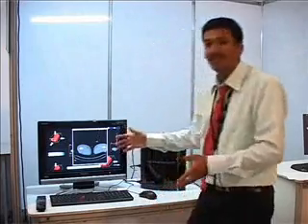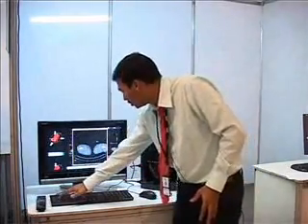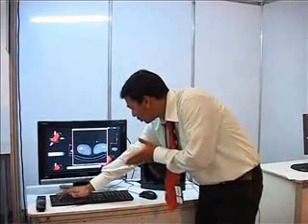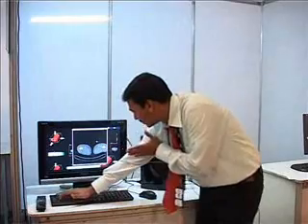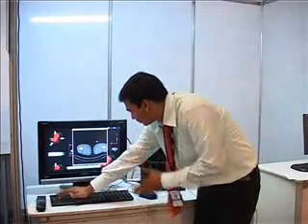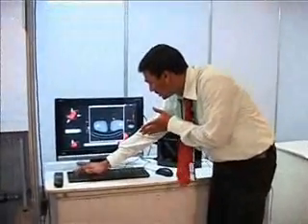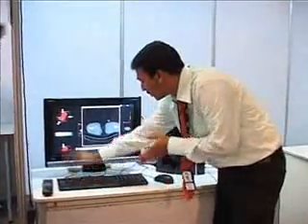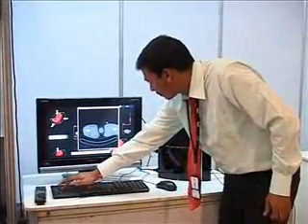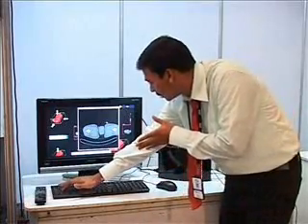This is the axial view, the front view of the body. This is the volume. From the volume, we are going to see the front view. You can see now we are going inside the volume. You can see the difference between the slices. We are going one slice at a time. We are going inner. Now we are here. You can see we are going inner into the volume.